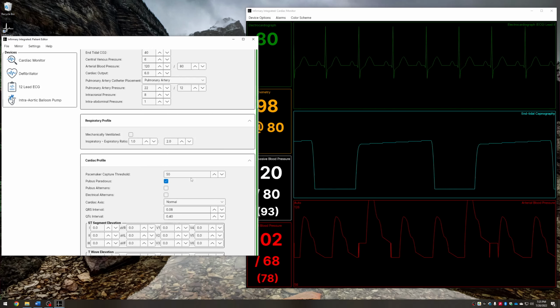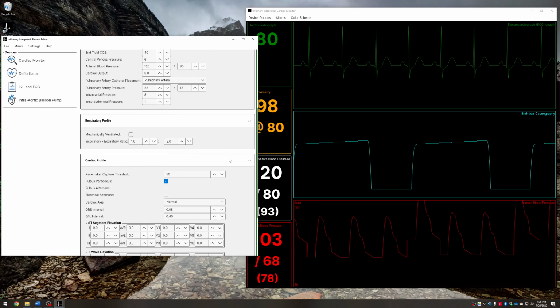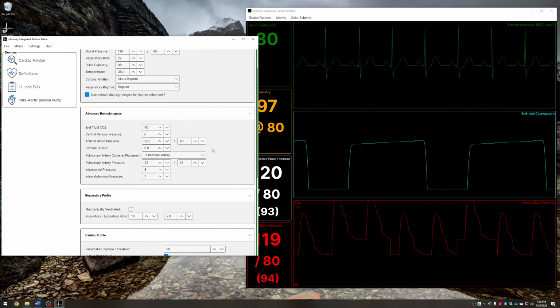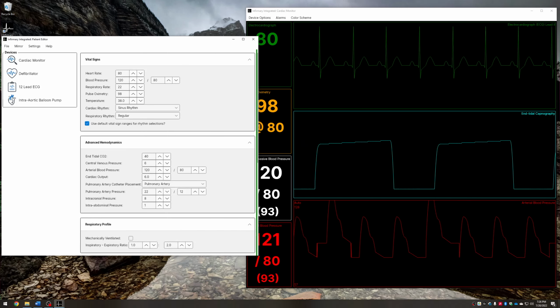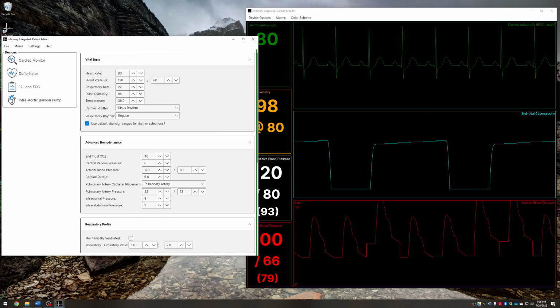So all of these things help show how some of the different parameters act on the patient model behind the scenes. Let's see. I'm going to now change the recording, restart a simulation so that we can look at some other features of Infirmary Integrated.